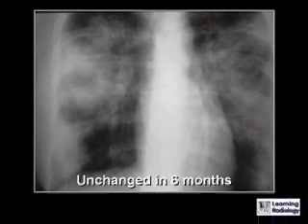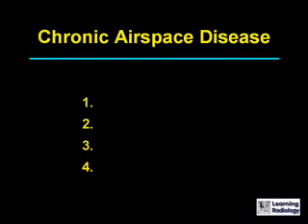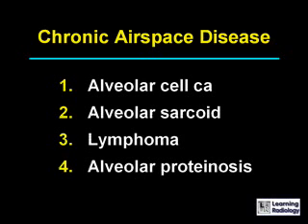This is the next differential. Pause the player. The differential is chronic airspace disease. There are 4 causes. Pause the player. The 4 causes of chronic airspace disease are alveolar cell carcinoma, alveolar sarcoid, lymphoma, and alveolar proteinosis.